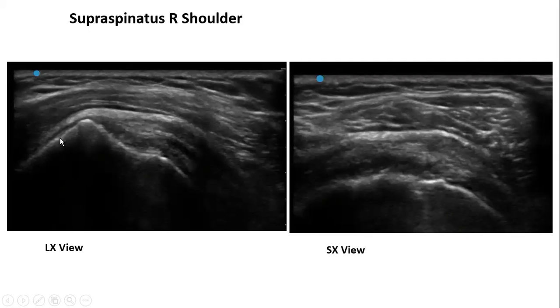And one more thing that you can see here, you see this part of the tendon. Normally, this part of the tendon, this is the rounded part of the beak, right? If you see this flattening, you always question whether some fibers are intact or not. If you see from GT to proximal portion of the supraspinatus bursal lining, if it is more straight over this area, you want to inspect this area very clearly, because most likely this is the bursa herniating into the defect, and there is no supraspinatus attached.